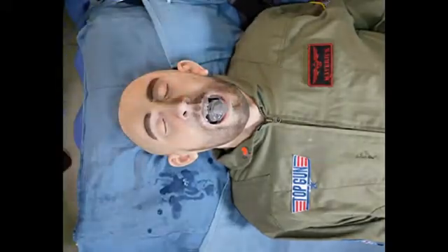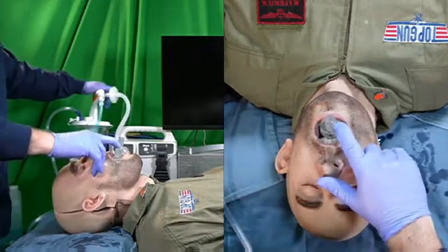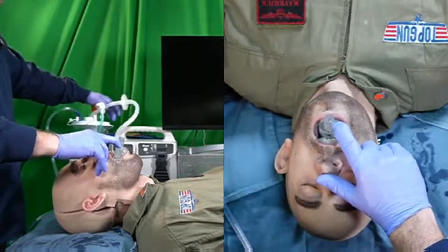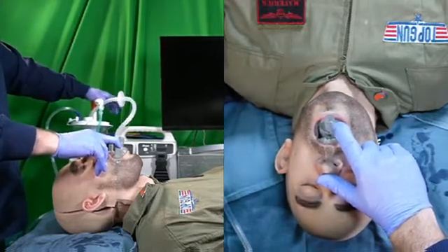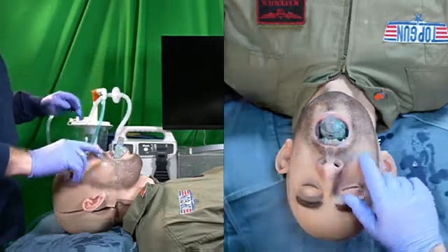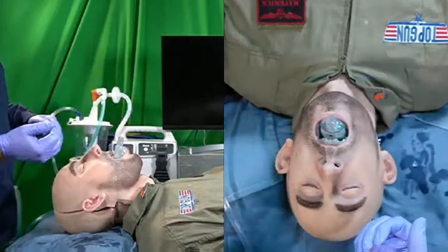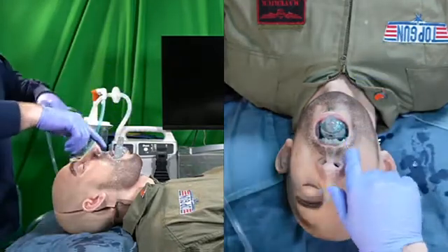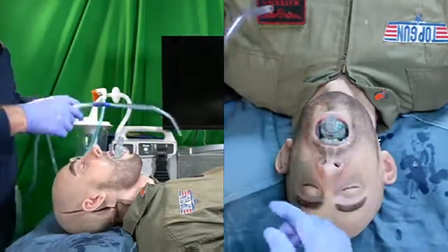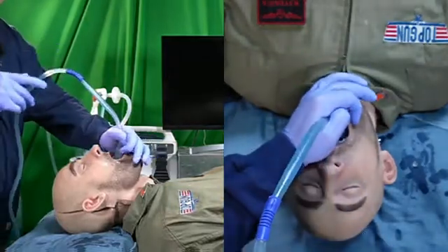Let's go ahead and give our mannequin a couple breaths here. I'm going to recontaminate this airway quite substantially to demonstrate the rapid airway decontamination maneuver again. Now I'm concerned more about the contaminant that spills over the bowl of the mask and into the ventilation channel than I am the contaminant that goes under the mask and out of the corners of the mouth. So what I'm going to start with is the rapid airway decontamination maneuver, otherwise known as the cornholio.